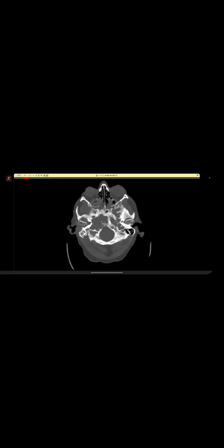Okay, but yeah, here. There is a destruction of the right squamous temporal bone. Okay, and one, yeah, second. Hold on, please. Hold on. Okay.